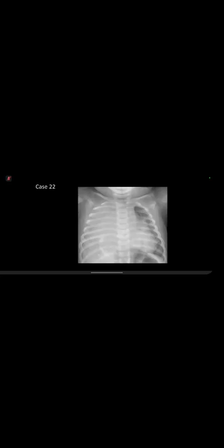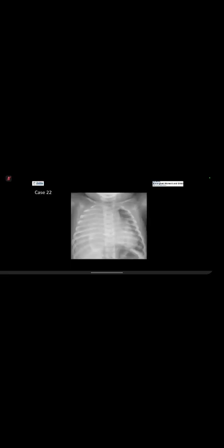Then there can be a concomitant pleural effusion also, or there can be a mass in the thorax also. Yeah, correct. So this is actually suspicious for a mass, because you can see that there is calcification, which is abnormal. If you have calcification, I think of a mass. Yeah, and you would want to go with cross-sectional, which is absolutely right.